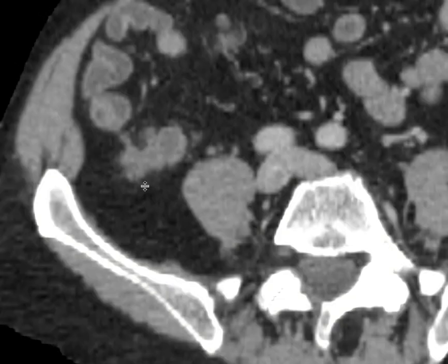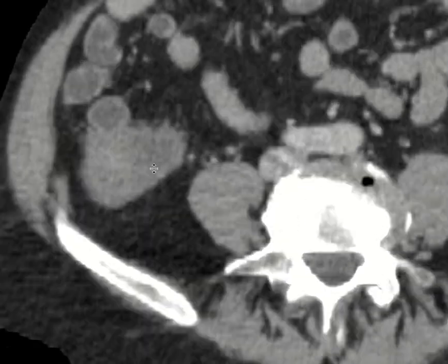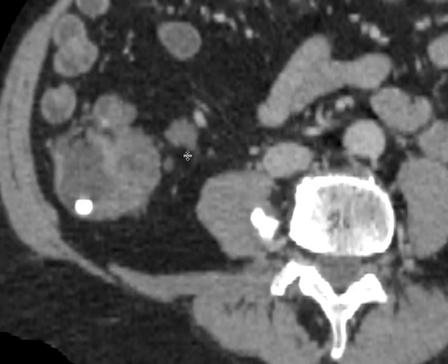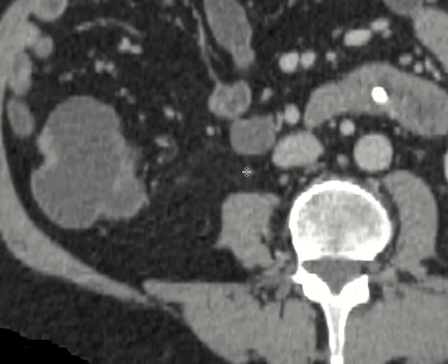This ends up being an irregular soft tissue mass, and so this is a patient with appendiceal adenocarcinoma. Now the drainage pattern for the appendix is important, and here you can see along the drainage pathway of this, there's an abnormal appearing lymph node that looks quite irregular. If we follow the venous drainage back again even more, we can see an even larger appearing implant or lymph node here.